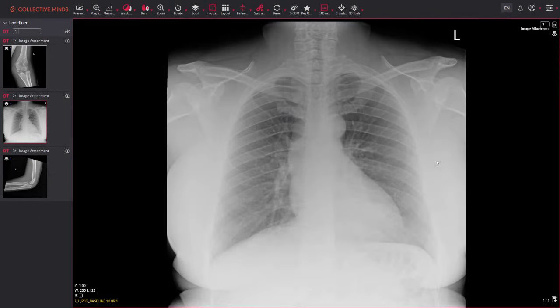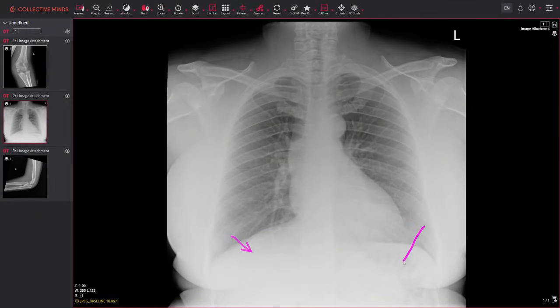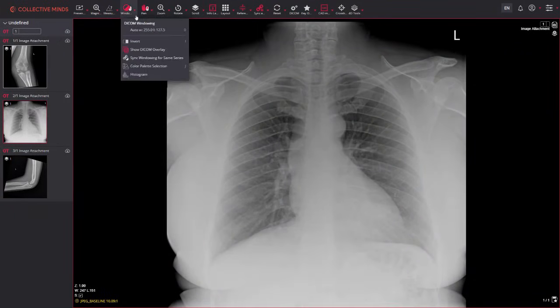A really important consideration with the chest is that, as I talked about with lung in these subdiaphragmatic regions here, we've got to consider these apical regions, that there is a lot of rib, a lot of clavicle overlying it, and similarly, the cardiac silhouette obscures a large portion of the left lower lobe as well. It sits behind the heart. So it's important as a second check, always second check these three areas at the end of your review. It really helps if you window the image. It helps even more if you invert it.